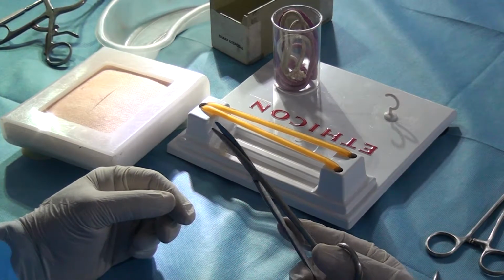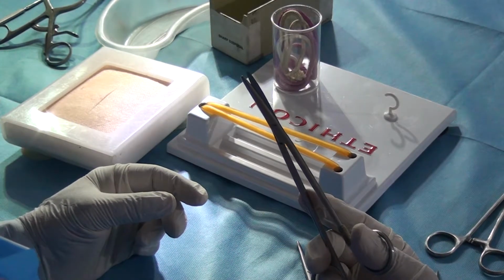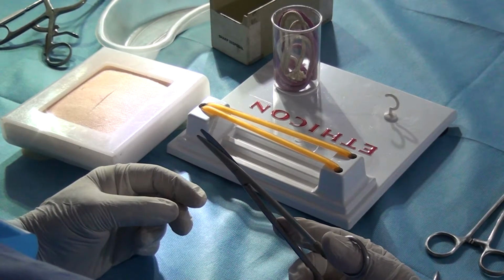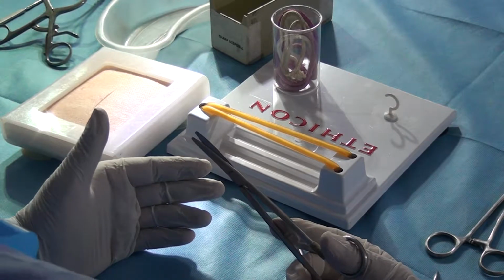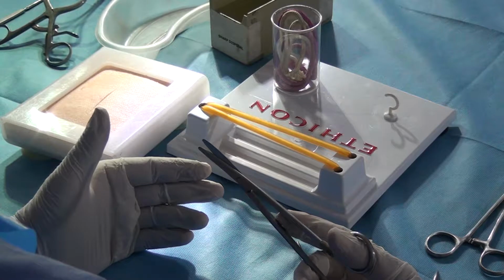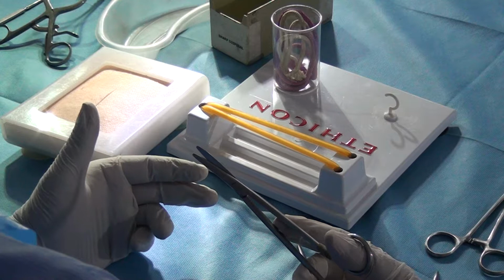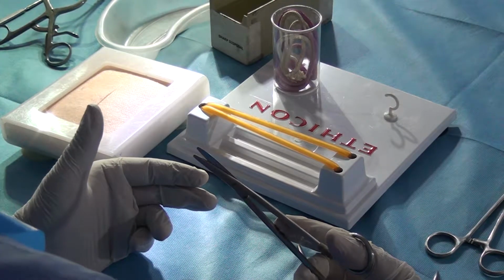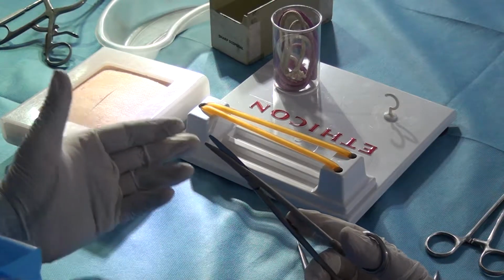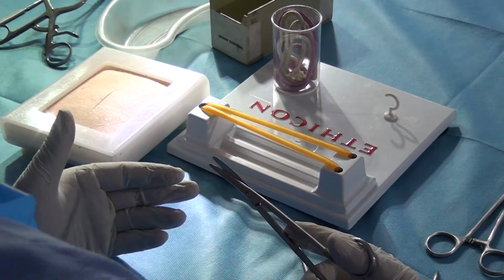So what is the right way to hold a scissors? Tip looking at me or tip looking at the sky. Because you must, now note down, must see what you cut and you must cut what you see. It's a principle of surgery. The second one is, you must tie what you see and you must see what you tie. Most disasters happen when this rule is not followed. Why? Because you will cut something which you should not cut, or you will tie something which you should not tie, and there is a disaster.